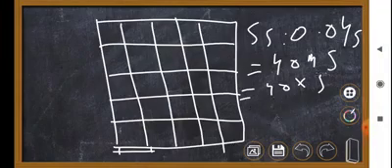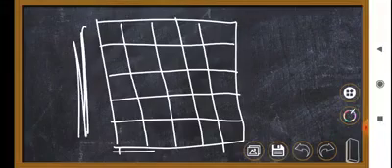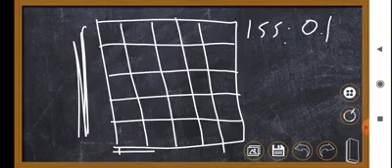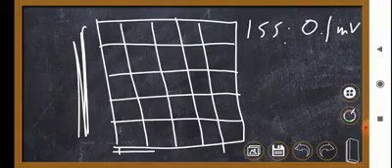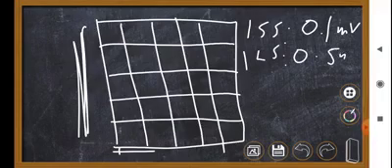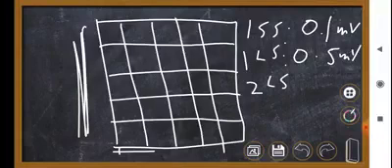Now coming to the vertical plane, as we have already mentioned, it corresponds to voltage. Please remember that one small scale is equal to 0.1 millivolt, and as there are 5 small scales in one large scale, one large scale is equal to 0.5 millivolts, and two large scales, definitely they will be equal to 1 millivolt.